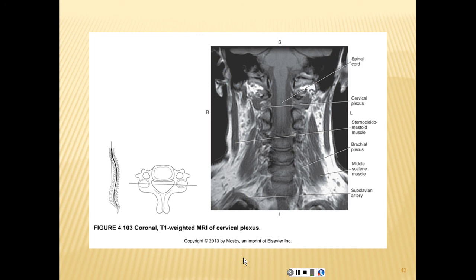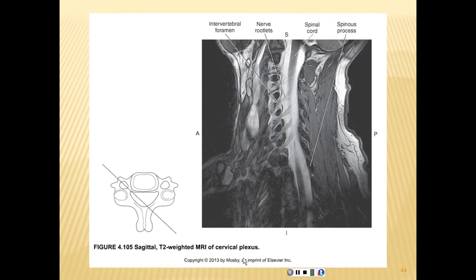That's the phrenic nerve. Phrenic nerve is the diaphragm. C3, 4, and 5 keep a fella alive. You dislocate or fracture that plexus and you cannot breathe. It leads to a condition very susceptible to demise, death. Sagittal T2 weighted MRI of the cervical plexus, page 231, I believe.